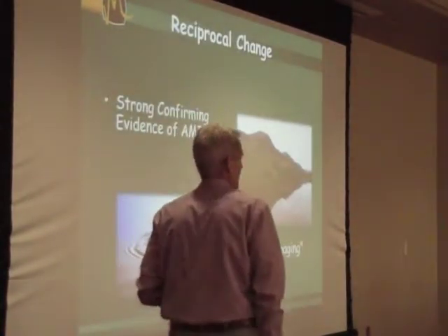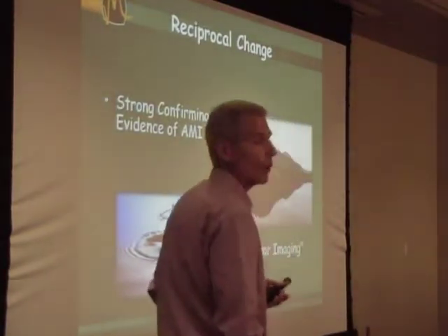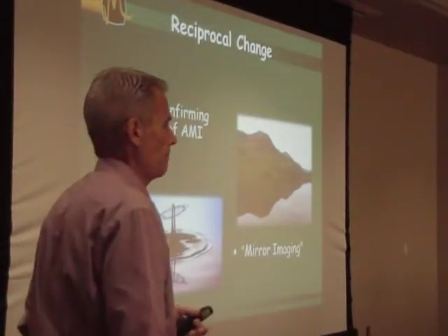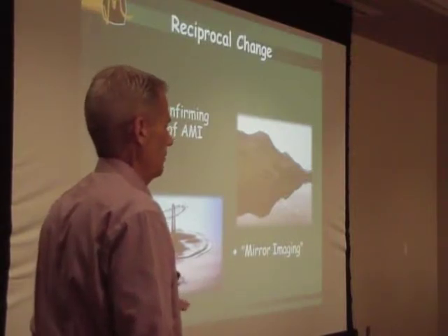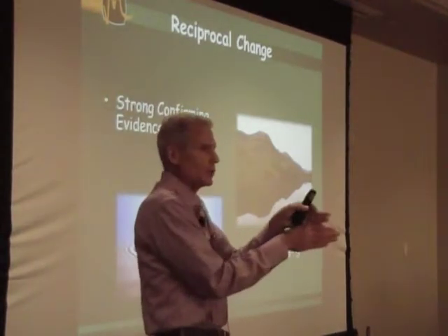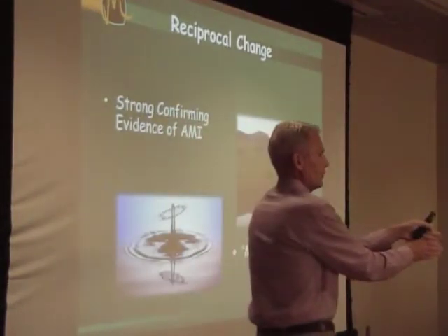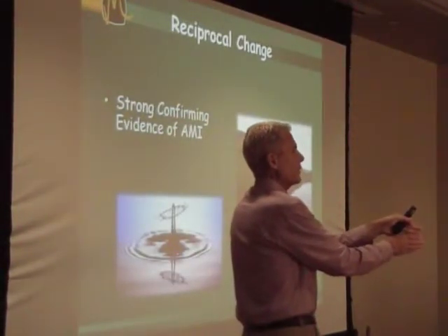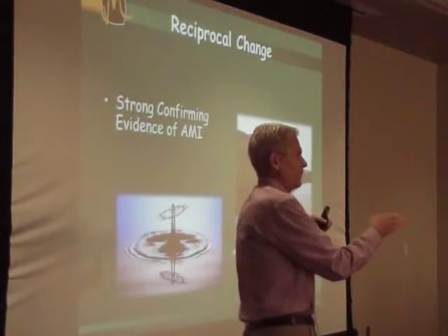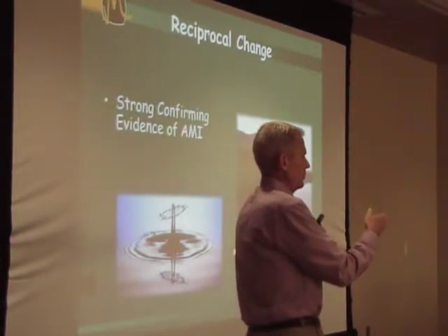Now, we've been looking at a lot of nagging ST segment depression on these EKGs as well. And most of you are already familiar with this, but we'll review it again. Reciprocal change. It's mirror imaging. So when we pick up the infarct process, we're relying on a skin sensor or a patch, the positive electrode, looking directly at the injury site. What if we were to take a picture of that same area from an opposing plane? The picture is going to look different. It's going to be a mirror image.